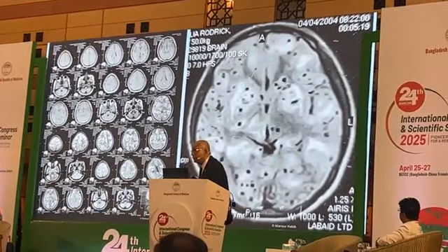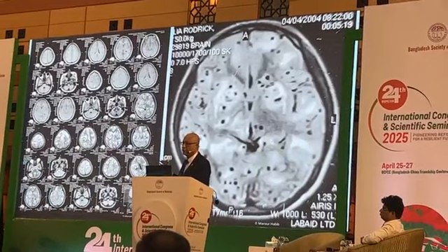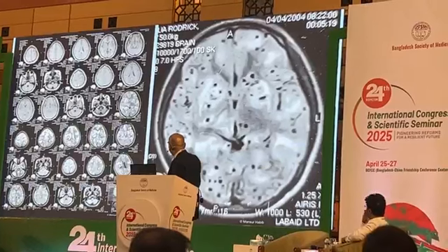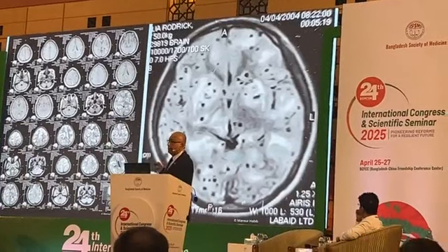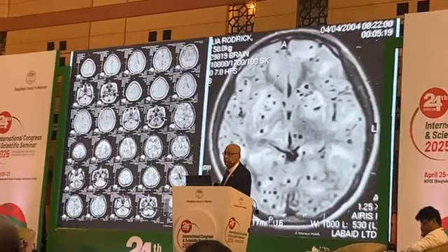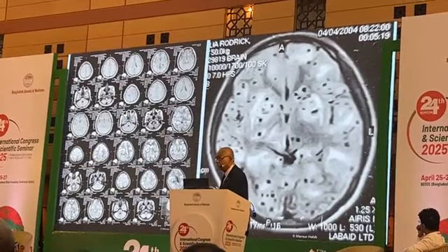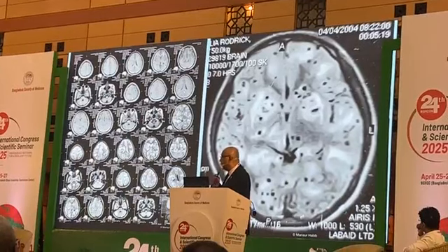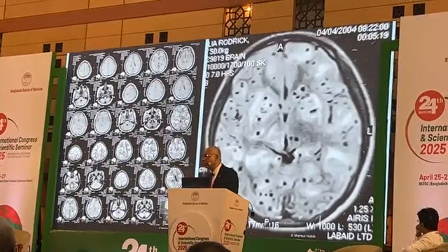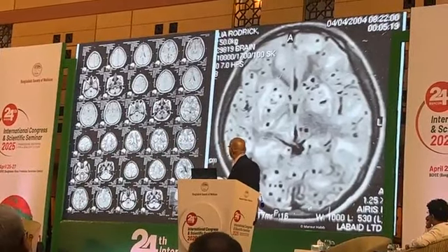This is a classic example and almost diagnostic of neurocysticercosis. And this is proven neurocysticercosis. These are active because there is perilesional edema. So, active neurocysticercosis. Very dangerous condition. Patient comes with all the features of raised ICP: headache, vomiting, all over the place, and also convulsing with seizures.